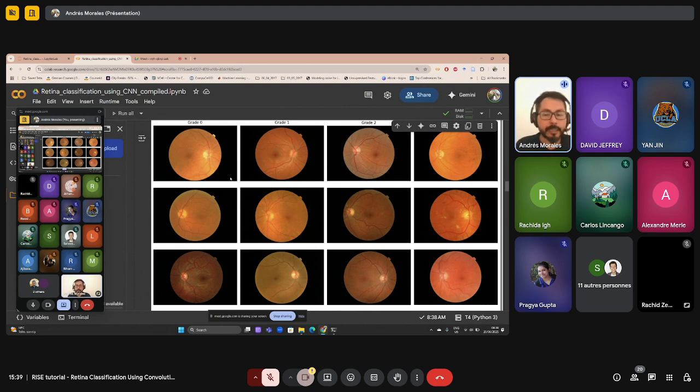In general, when we are working, especially with pre-trained models, we need square images. And this case in particular is very convenient because we are talking about an object that is spherical. You have basically a circle there, so that is symmetric. With these images, we have a lot of data that we will not use at all. You see here that we have black space.